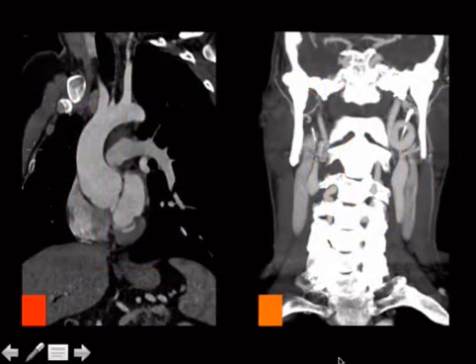Okay, so this is a compare and contrast of 2 similar pathologies. There are only a few true Aunt Minnies when it comes to vascular imaging. This is one of them, which is the tulip-shaped aorta, where you've got ectasia of the annulus and the aortic root.